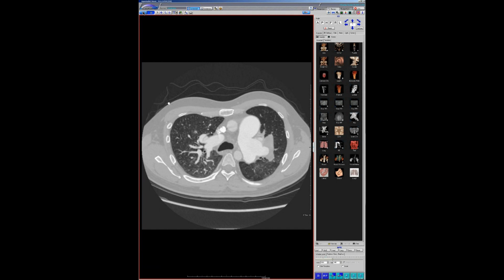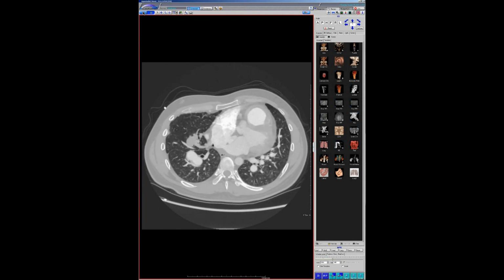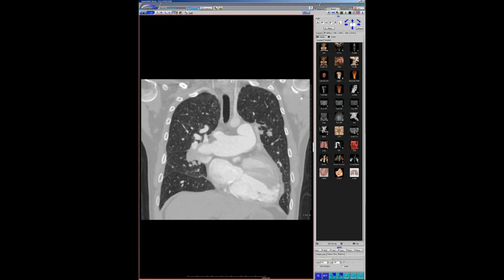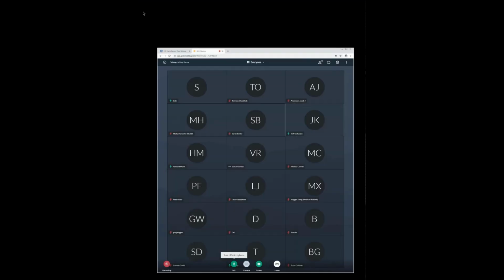The diagnostic cath report said that the LAD was trashed, which we said, but in the first diagonal branch, they said the circumflex was only mild. And they said, yeah, there was a moderate circ lesion, which there was, but they said that the obtuse marginals were fine. And I was kind of disappointed, but then he got a diagnostic intervention and they went ahead and said, actually, no, yeah, the LAD is trashed, but in fact, as I expected, just based on the distribution, the first OM was completely gone, totally occluded.